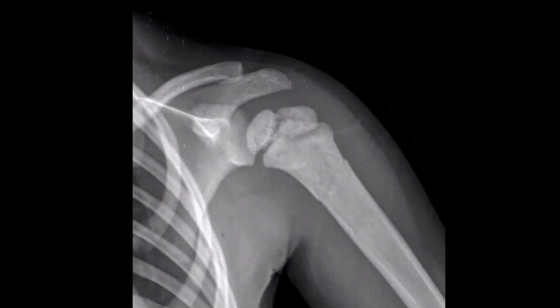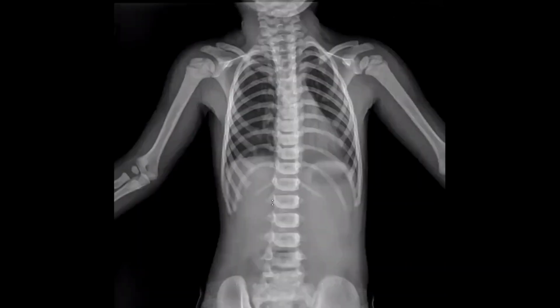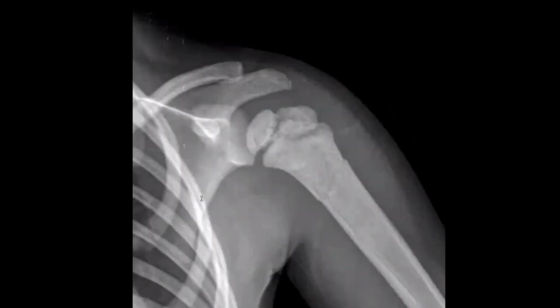So you did very well. This is a pediatric case with increased bone density, symmetrical density increase of all the bones. It could be osteopetrosis, also with this pathological fracture, as it is marble bone disease, which shows a lot of fractures. So we have a fracture here in the upper humeral shaft. I would look at all the other bones just to be sure there is diffuse sclerosis in osteopetrosis, and also I would look at the jaw.